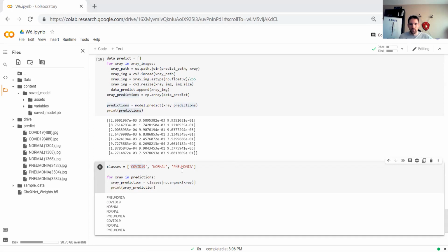And of course, if you want to do some more coding, you can figure out how to make a graphical user interface with buttons that you can click on, and like a file system that you can load files and make it like a nice, easy to use interface instead of all this code. All right, that is it for how to detect COVID pneumonia with machine learning. I hope it makes sense. I tried to keep it kind of simple. Any questions? Hope it all made sense.